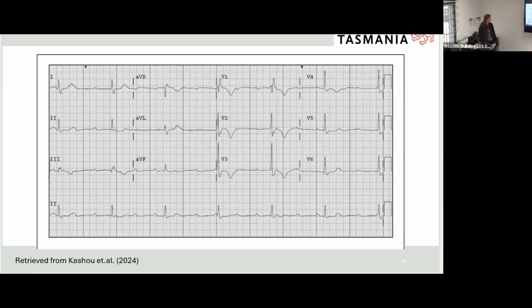No, from Jack. Seem to be the same length. Some are more peaked than others. Yeah, one seems bigger and one seems smaller. Yeah, I'd probably agree with Zoe. I think we've got two different P waves here, so potentially two sites. I think we've got this one here, which is maybe a bit more peaked, and then this one here, which is potentially a little bit flatter and more.